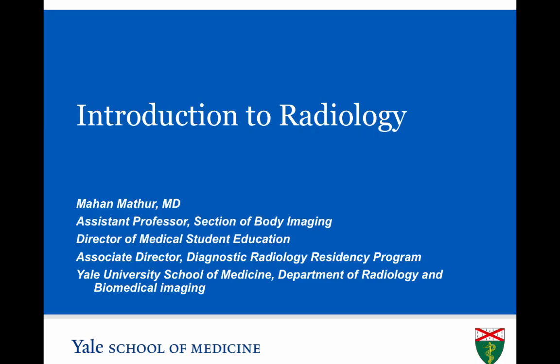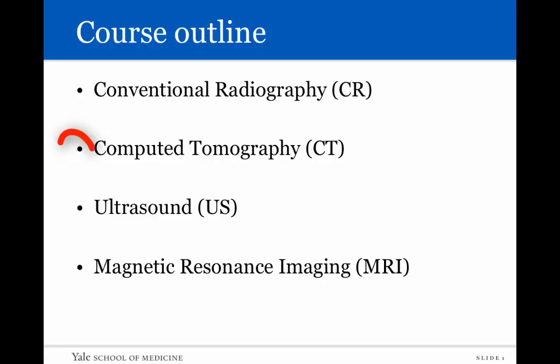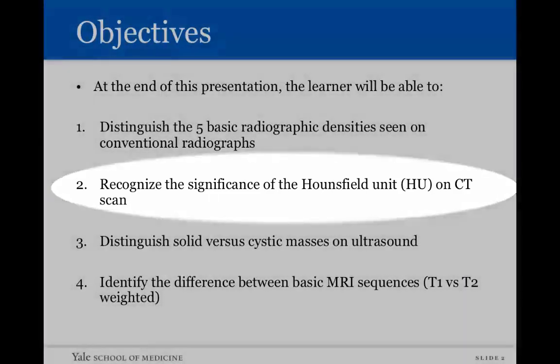Hello, my name is Mahan Mathur, and this is the second video in our Introduction to Radiology video series. In this video, we'll be covering computed tomography or CT imaging, and the big objective to get out of this is to recognize the significance of the Hounsfield unit on CT scans.